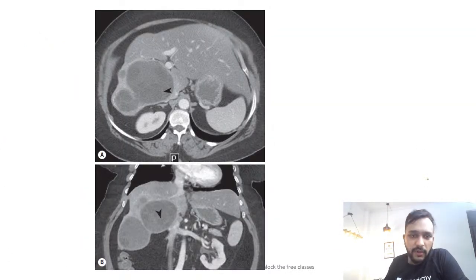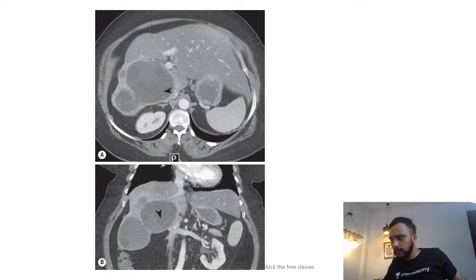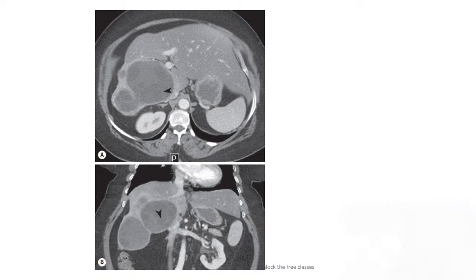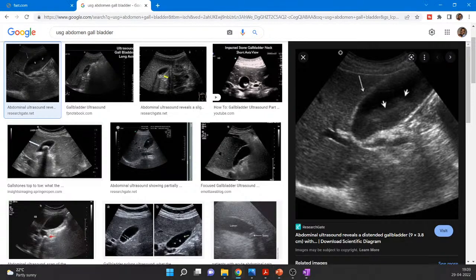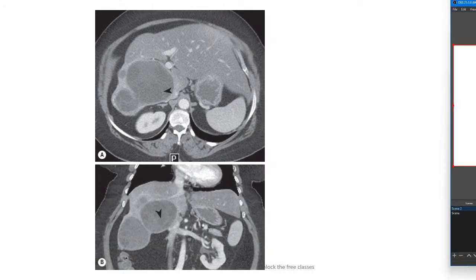Now guys, moving on to the next image. Guys, what are you able to see in this image? Anyone? What are you able to see in this image? Anyone guys?